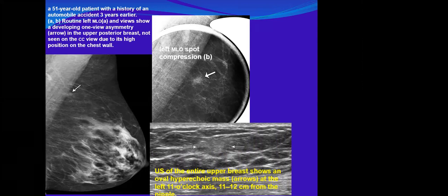You ask for ultrasound. What about the ultrasound? What is your impression from the ultrasound? Indistinct hyperechoic mass.